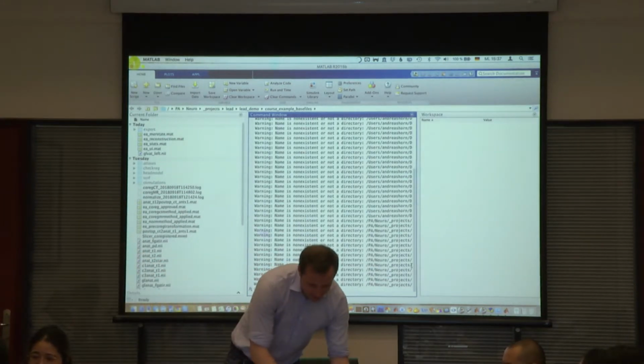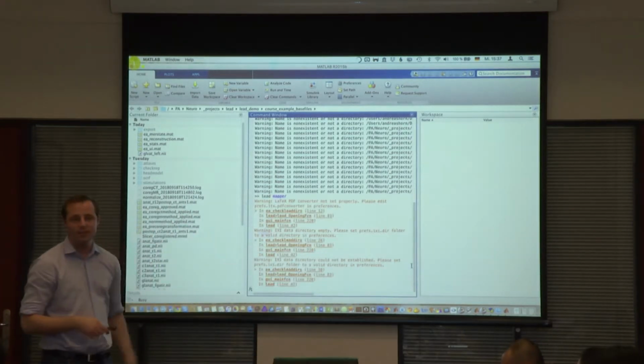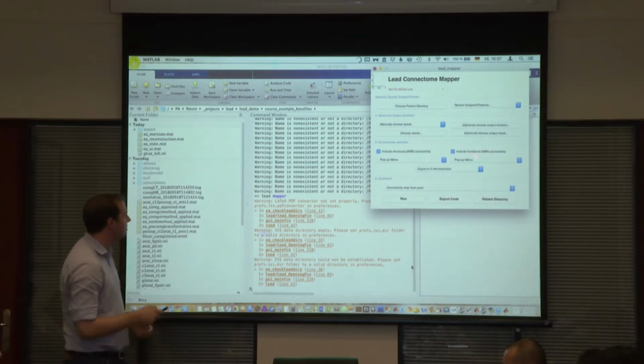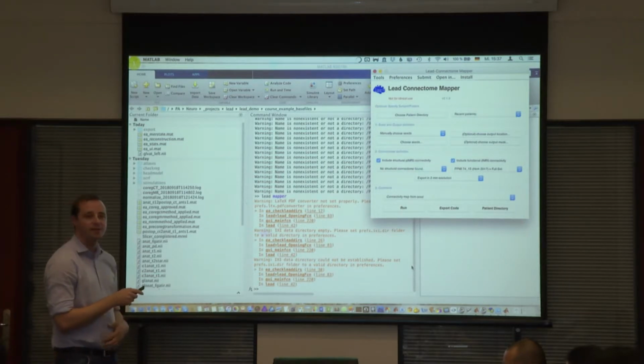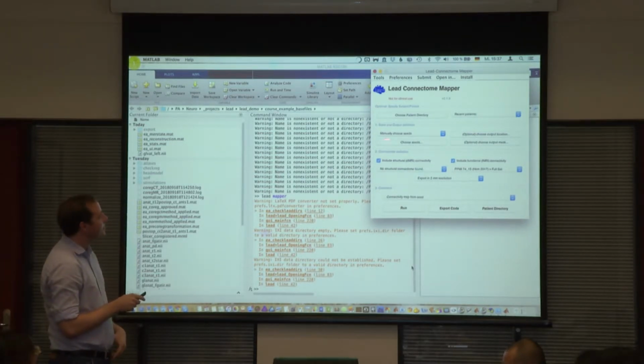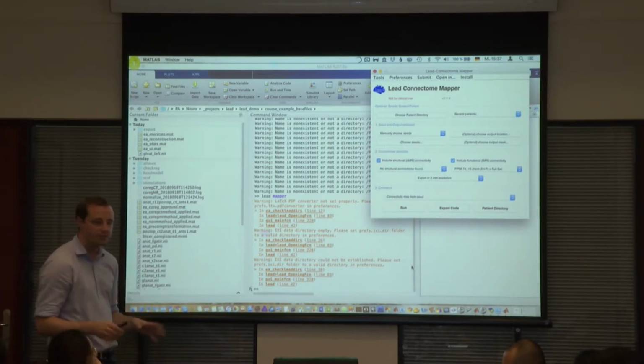But we can also use any other NIfTI file to do so, right? So instead of using the VTA of any patient, we can just use a NIfTI file. So actually this part where we choose the patient is optional. You don't even have to use a patient here. But you could just start with manually choosing a seed, manually choosing a NIfTI file, right?